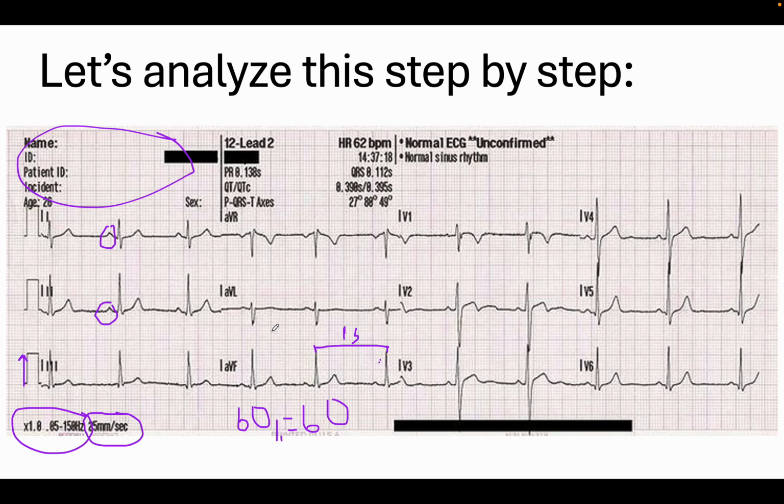They're slightly flat here, which is fine. And then they look slightly strange in our precordial leads here. So there's some slight high takeoff here. Again, that's explored in a different video. But then they look normal here.